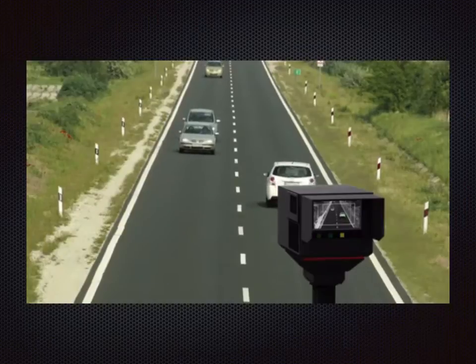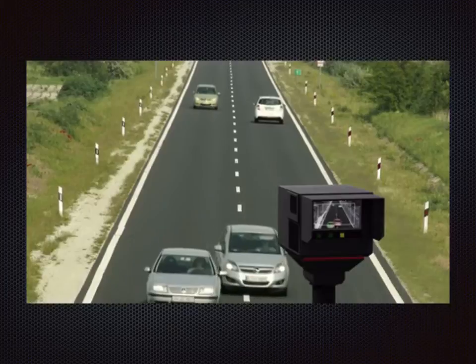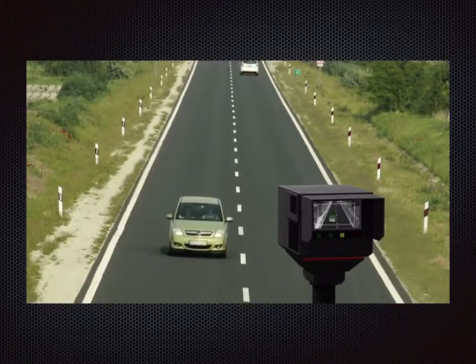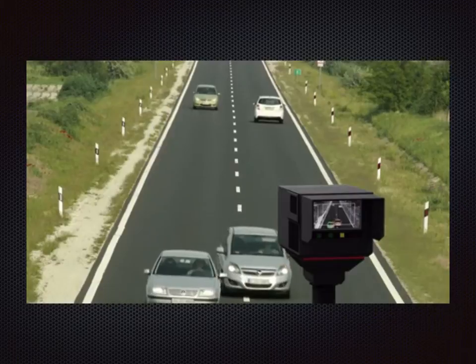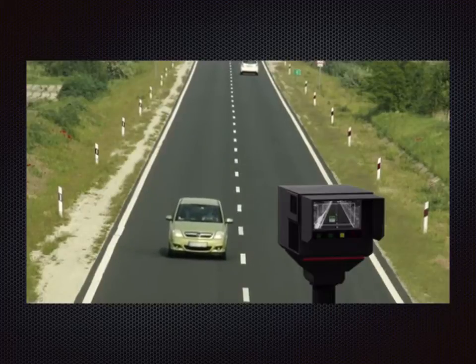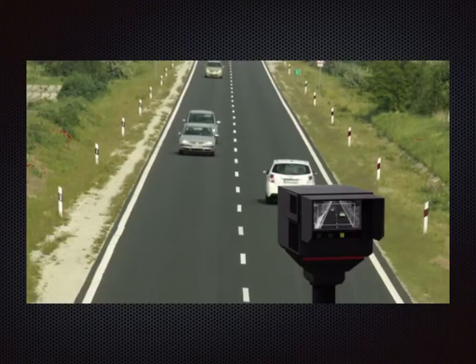Now, some of you might have driven too fast and got clocked by a speeding camera. And so speeding cameras work because they use Doppler. And Doppler is something we encounter every day in our lives when we hear sirens of police cars. And as the police car comes towards you, it appears that the siren sounds at a higher frequency than when it's travelling away from you. This is because the sound is influenced by the velocity of the moving target.